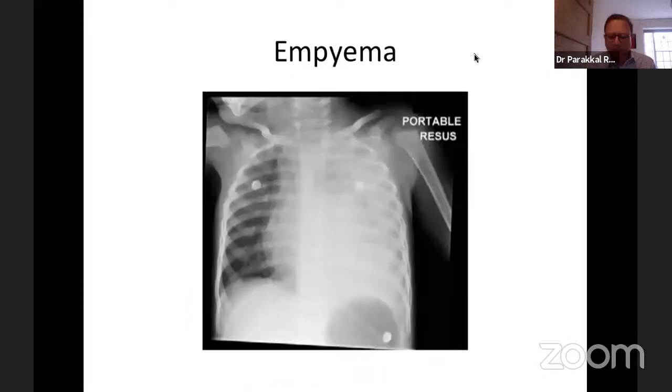The complication of pneumonia then obviously is empyema. And we tend not to do CT scans routinely when we find a picture like this. We tend to do ultrasounds. Again, because of the thinness of the chest wall, we are able to get good resolution images on ultrasound. And it's exceedingly rare that we find tumors behind this. Normally, it's either a sympathetic effusion or an empyema.